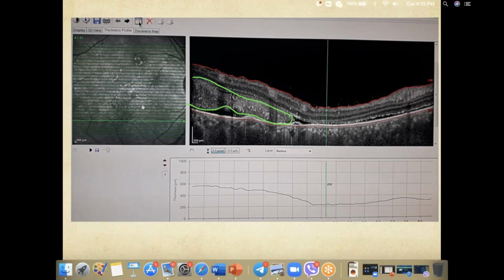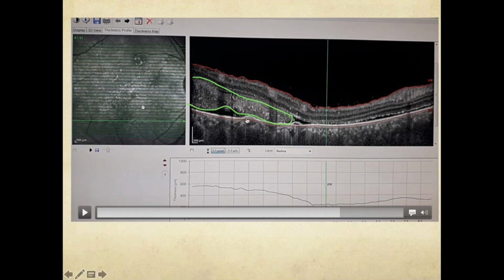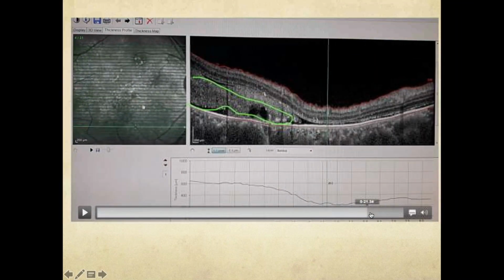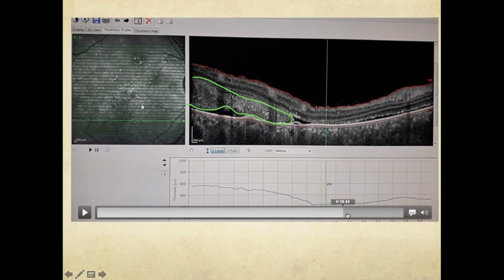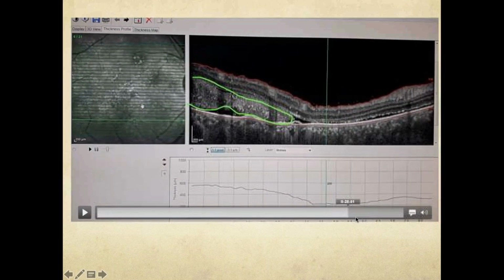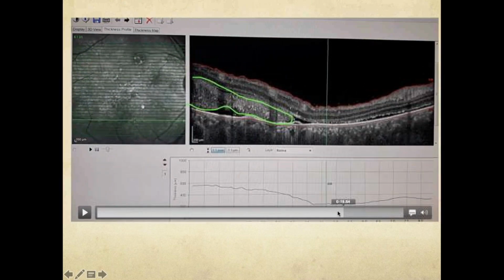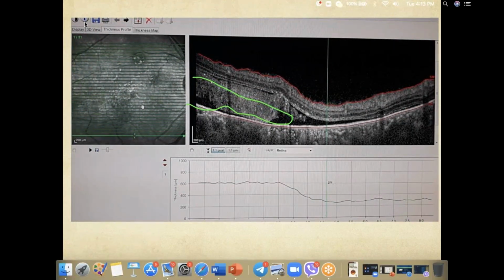No lumps and bumps, just simple PCV; lumps and bumps, VKH. This is a subretinal abscess. So this actually turned out to be ocular tuberculosis. There you see this is a subretinal abscess. So these are some of the rare but very important OCT findings.